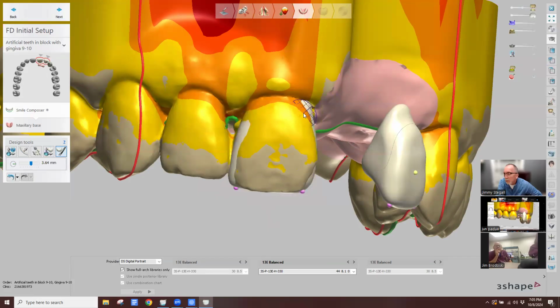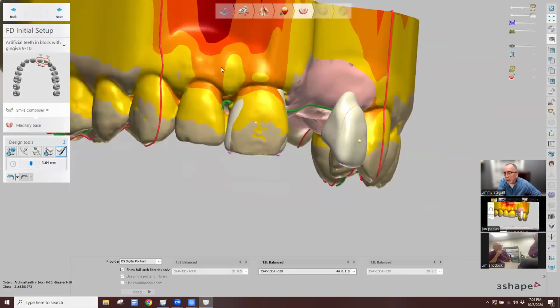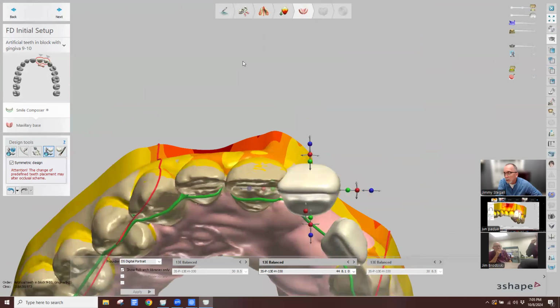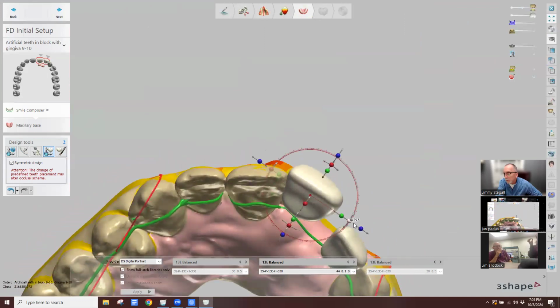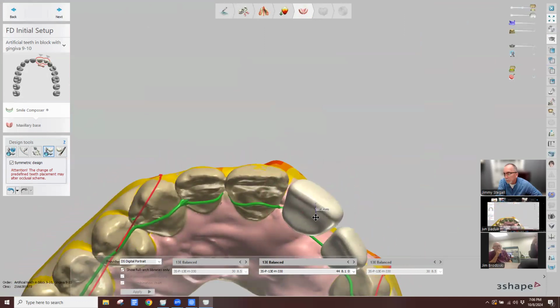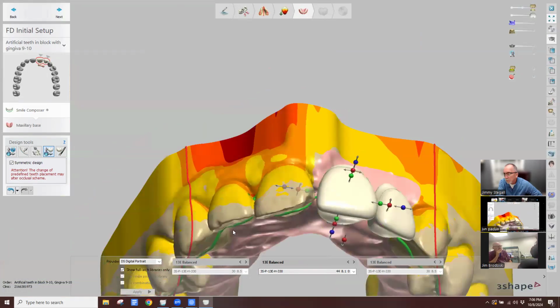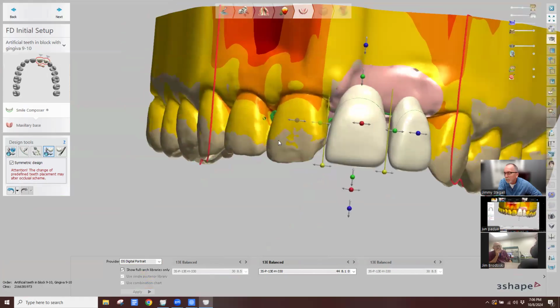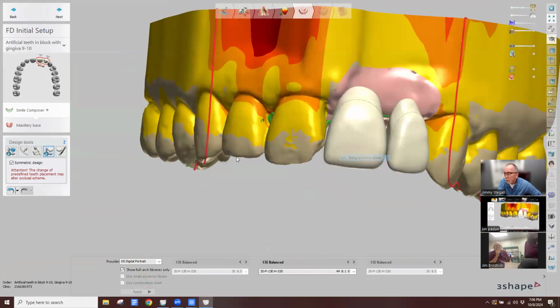Now, obviously, I've got it reversed, but I'm just trying to get close to the mold. And if I'm close, now I can come back over here and start to get it in a better spot. I always right click, bring it to mirror plane.